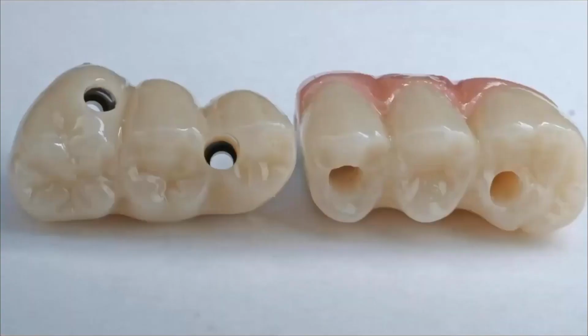Here's another example, and I love this example. This is a case restored by the student clinic at MUSC. This case was done by one of the residents here at MUSC. The bridge on the left side, the implants were placed freehand. The bridge on the right side of your screen, so the patient's left, was done with guided implant surgery. And I think, same patient, different sides of the mouth, totally different philosophy on how implants should be done.